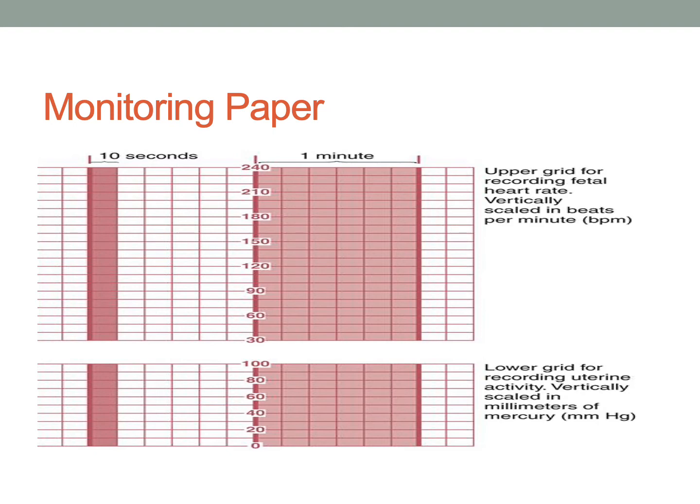So when I say my fetal heart baseline is 125, it means that my heart rate resides between the 120 little line and the 130 little line, somewhere in the middle. And I would categorize that as 125. Right, so just so that you have an understanding.